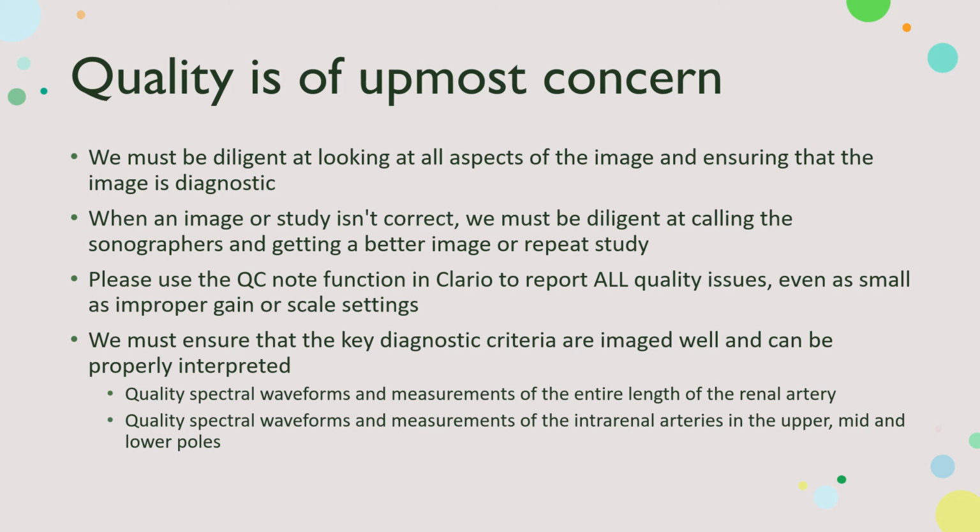Now we're going to move on to ultrasound quality control. We have to be diligent at looking at all aspects of the image and looking at all the images. If a study is not complete or something's incorrect, we have to call the sonographers and let them know what the problem is and what they can do to fix it. Hopefully the patient doesn't have to come back, but if they need to come back, bring them back.